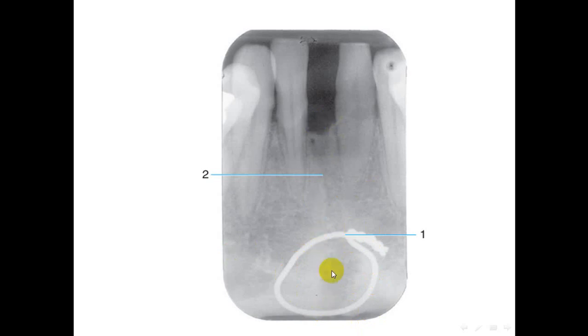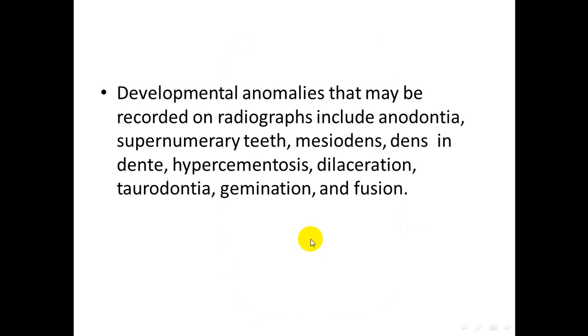This patient is suffering from a fractured mandible, and the surgeon sutured the fracture with a surgical wire. The mandibular fracture is indicated by the radiolucent line, which indicates that there is a fracture on that side, treated by surgical wire.